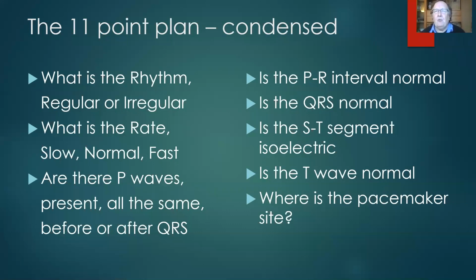But it could be that the patient's having paroxysmal sessions where they have bouts, and I suppose that's where that fits in. To work out whether it's regular, we can get a second piece of paper, line up the R waves, move it across one complex, and if they all line up again, it's a regular beat. And of course, we talked earlier about our central heating system. A pump that works regularly will give us a warm house, and a pump that beats irregularly will give us a cooler house.